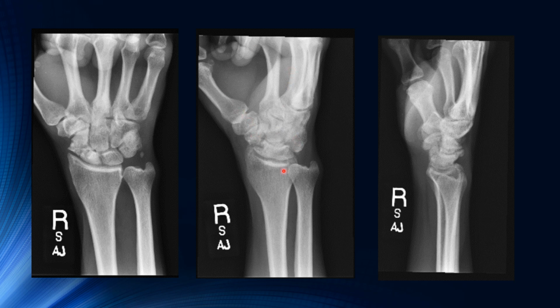The oblique, it looks like their hand is obliqued a little bit too much. And again, we have those fingers curling back. The lateral, the radius and ulna are almost superimposed. It looks like the wrist is turned. You can't quite see that lunate really nice. And it looks like the hand is also cupped here. So you need to straighten out the carpals here. And maybe that's all the patient could do. Maybe it was very limited. We're not sure.